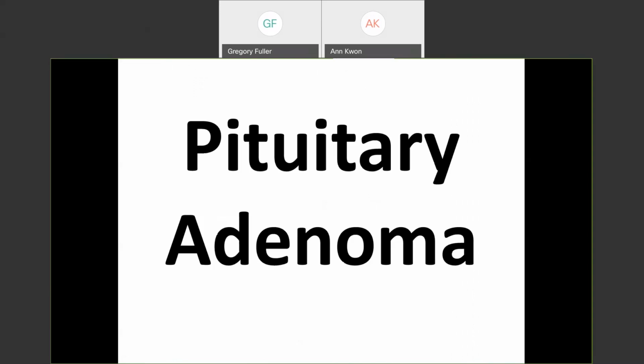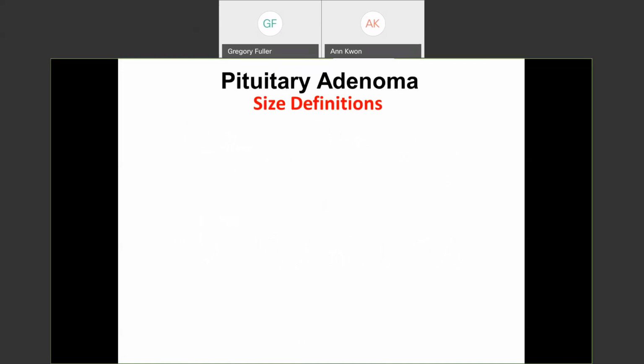All four of these are pituitary adenomas destroying parts or all of the clivus. Listen, everyone in this room has seen pituitary adenomas that erode through the floor of the sella, erode through the walls of the sella into the cavernous sinuses. That's bone. They're going straight through bone. They can do it to the clivus too, as these examples show.